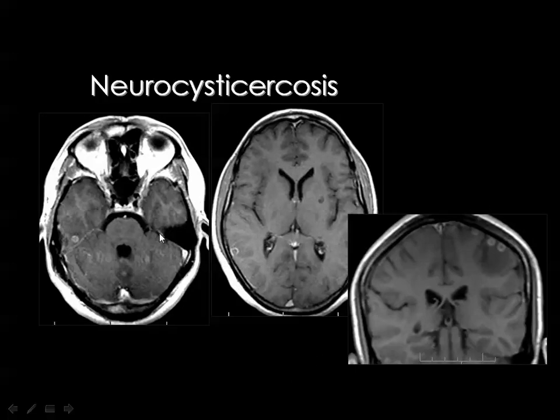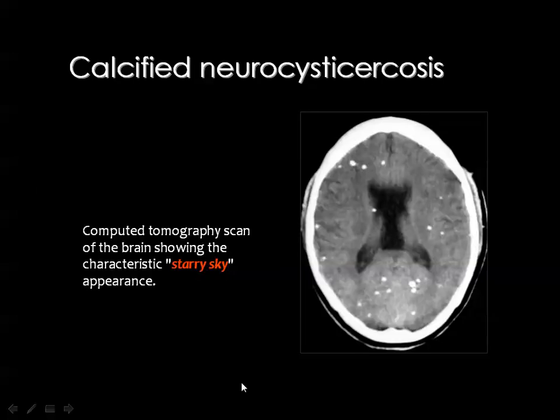And this is a patient with lesions where you may be able to see the cyst and dot sign somewhere, like this one. Then you go to the diagnosis of cysticercosis. If you cannot appreciate this, you will diagnose these as tuberculomas, and you will not be so far from the right diagnosis.